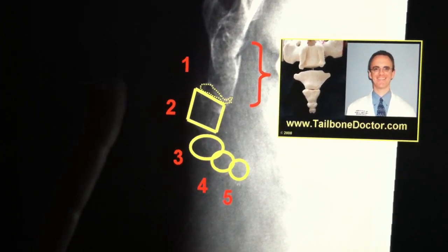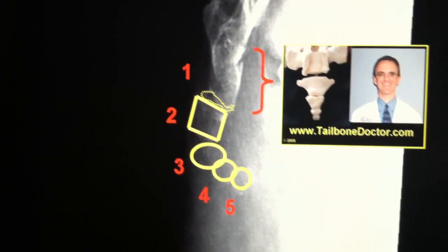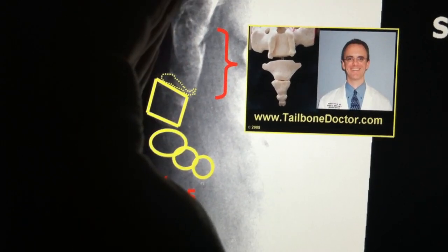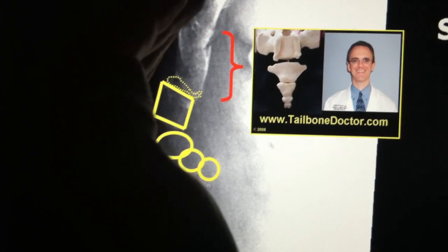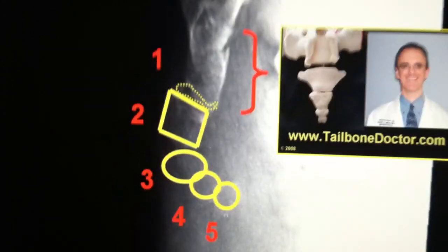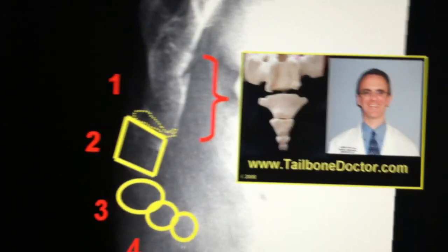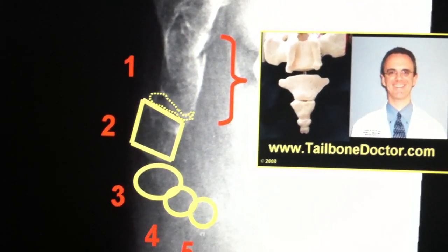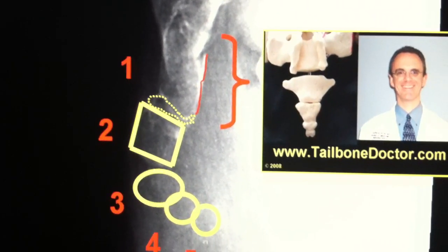To the left would be outside of the patient, and the skin would sit right there, kind of right where the numbers are in this particular demonstration. Anyway, I'm going to come back in here a bit, and again, just looking at now where I've made that red line here.